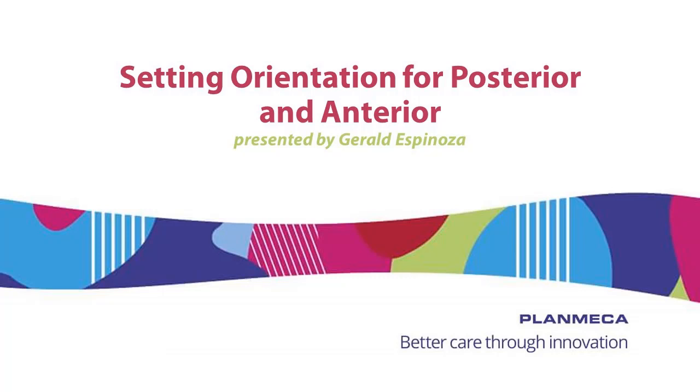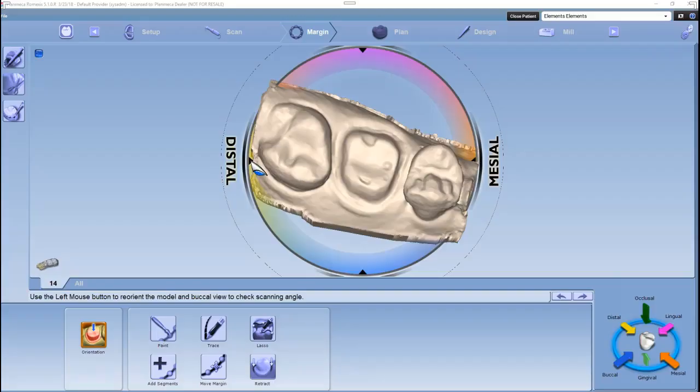Today in this video, I will show you how to set an orientation for a posterior and anterior case. The orientation has two purposes. One, to set the case up for good design. Two, to set the tool path for milling purposes. Let's start by explaining the 3 steps for a posterior and how to set it up for a good proposal.